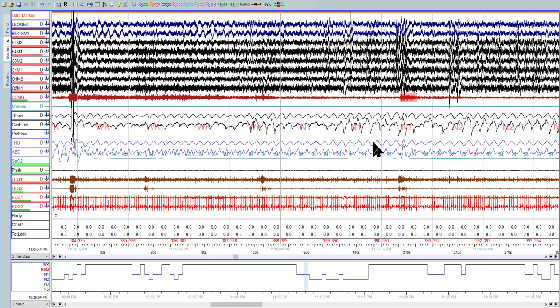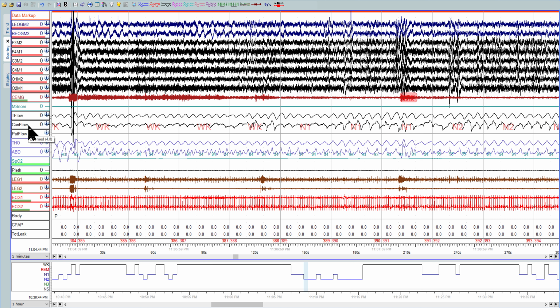Maybe, maybe not. Your baseline is right in here, which I think now I've kind of got this a little bit too big. If I decrease this a little bit, baseline, and then this dips well enough below baseline for me to mark that as a hypopnea from the first reduced breath being there to the first normal breath being there.